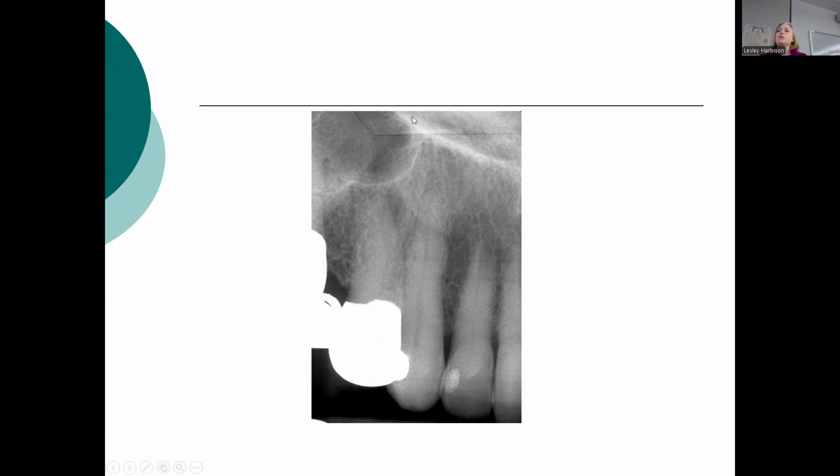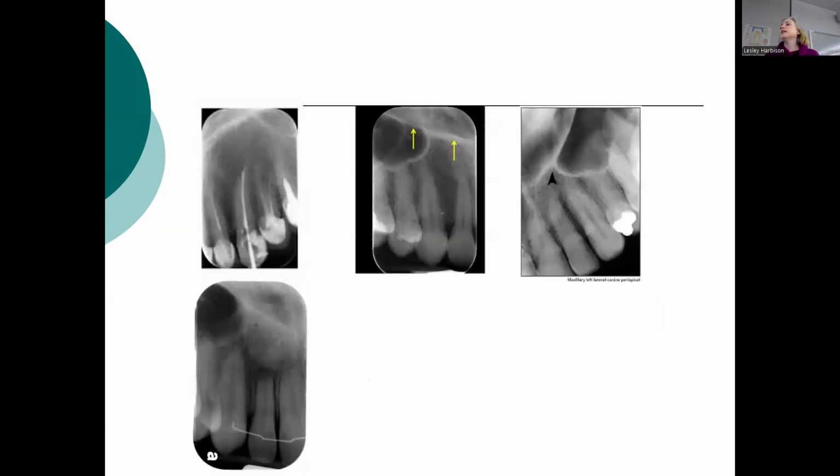So the inverted Y shows up radiopaque, and it just looks like an upside down Y. The inverted Y is a landmark that you want to recognize. There are lots of different images of the inverted Y because you already know, just from taking your pictures on Dexter, that the canine shots can look all kinds of crazy.